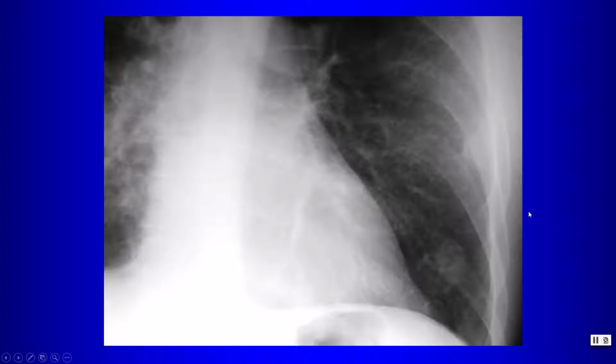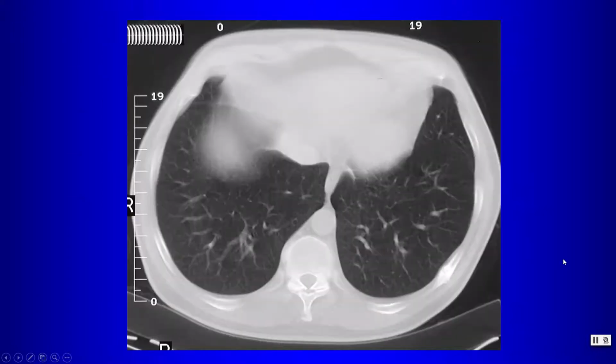So another common problem that we might run into is a nodular opacity like this, also overlying the rib. This represents callus from a rib fracture. So you can see that also on the CT scan. So again, it's important, especially if you have serial chest radiographs, if you notice that the nodule always remains in the same relationship to a particular rib, that we may be dealing with a bone lesion and not really a lung nodule.